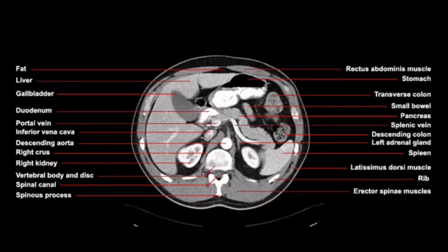It's a long, slender organ, and you'll also notice this blood vessel here, which is closely associated with the pancreas. That's actually the splenic vein, and sometimes we can also see the splenic artery. Two more organs that we can see that I think are easy to identify are these large round structures on the patient's posterior abdominal cavity, and that is the right and the left kidney. In this image, the brightly enhanced portion of the kidneys is the renal cortex, and inside of the renal cortex is the portion that we call the renal medulla.